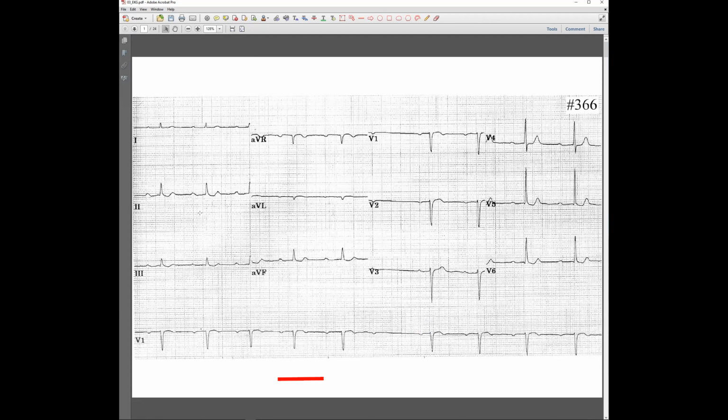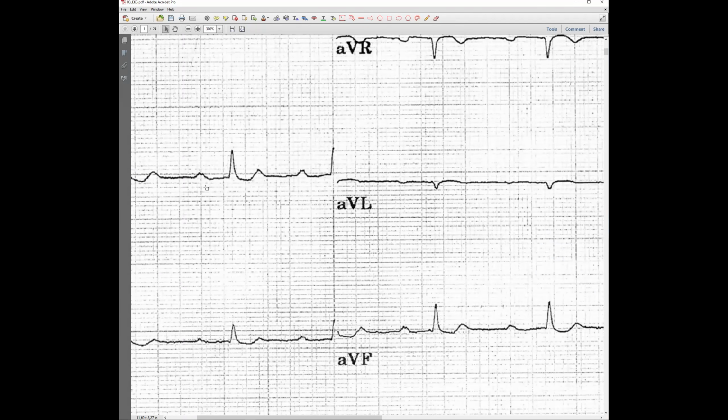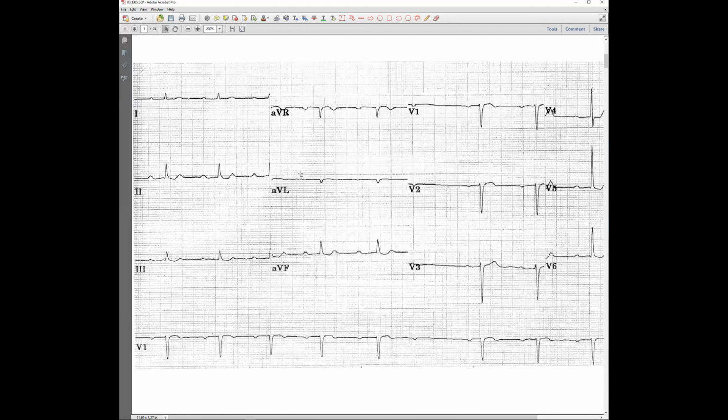Now another thing, you should concentrate on the shape of the P wave. As you learned, the base of the P, so the length of the P, should be around 0.1 second, so half a square, and the magnitude should be about 2.5 maximum. But this is normal, okay? Great. Next one, the QRS complex. Is it wide? No, it's normal. Axis? Normal.